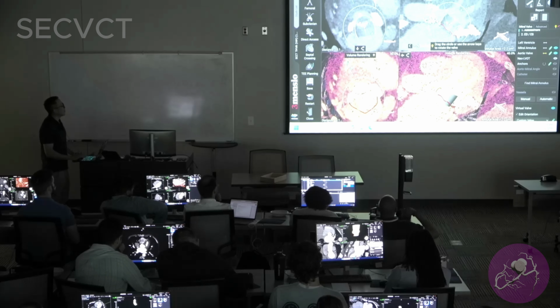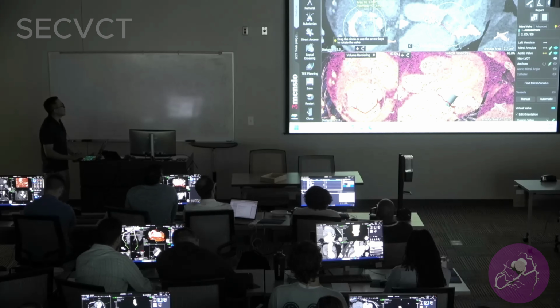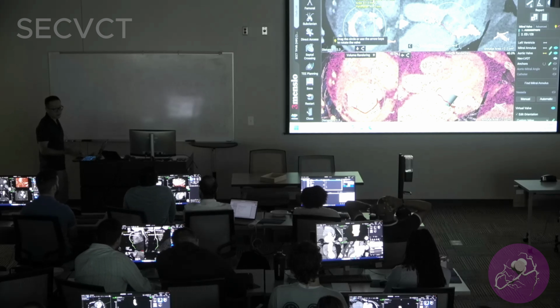So this one, same thing. I drew out the LVOT already before, and then I basically go ahead and measure where it looks the tightest. And I already made a measurement from before, so I'll just click on that to show you. And look at this area. Look at the difference here. 87 millimeters squared, right? And 200 is a safe cutoff. 180 is like a bare minimum. So this is a case where visually it looks like it's going to be tight, and then more objectively, it for sure is going to be tight.